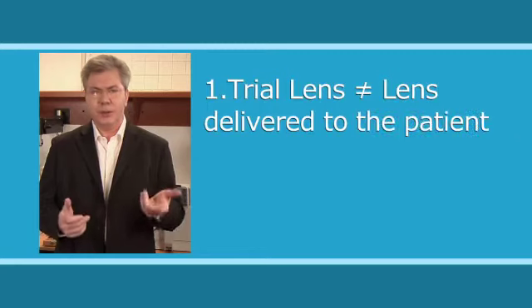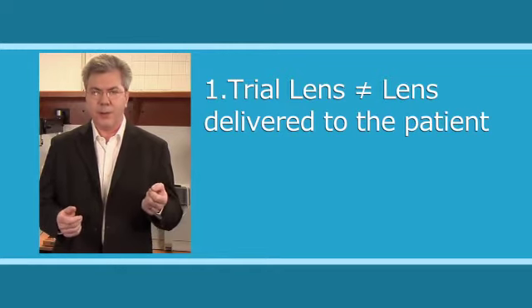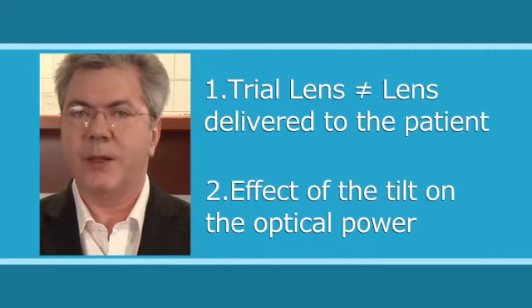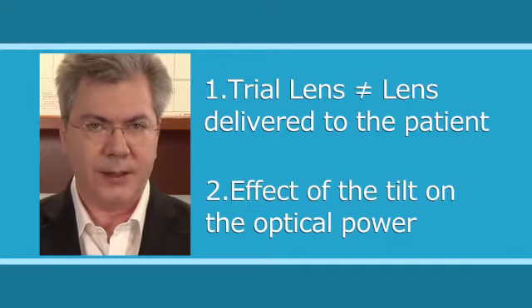Hello everybody. This workshop has two main goals. The first one is to show the differences between the trial lens and the final lens delivered to the patient. And the second one is to demonstrate the effect of the tilt of the trial lens on the optical power and to understand what is the task of the designer.